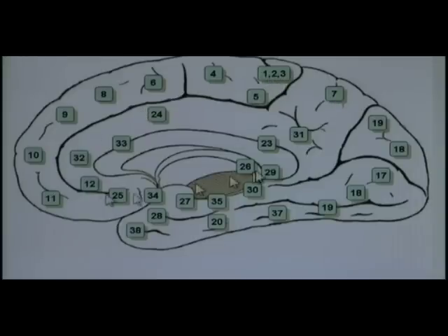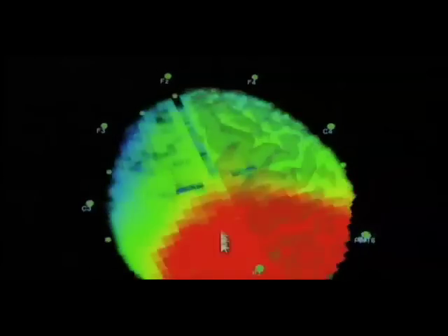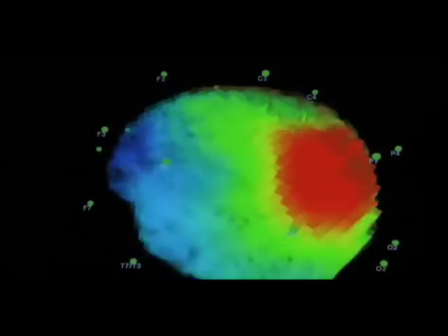And we're going to use these numbers in order to control the software, in order to decide which parts of the brain we want to look at. So the example we're going to look at is going to be area 19, for example, right here, where we see this is the secondary association area for visual processing, and it's also very dominant in this person's alpha. So what we can do then in the software is to select training channels that look at these Brodmann areas.